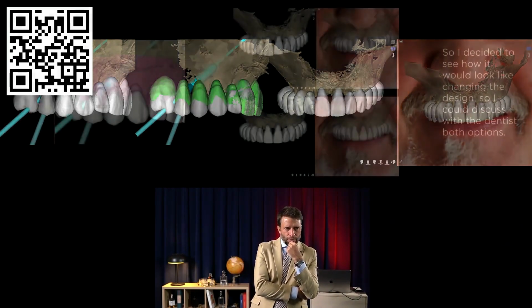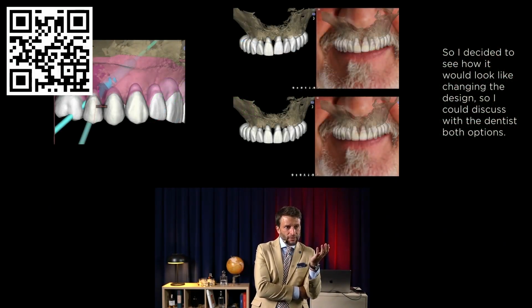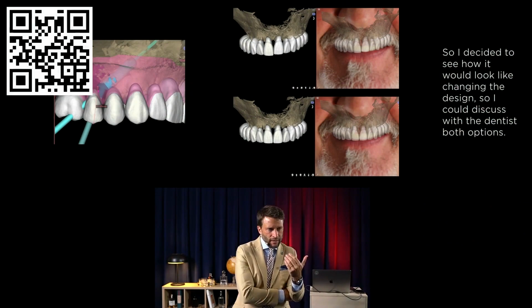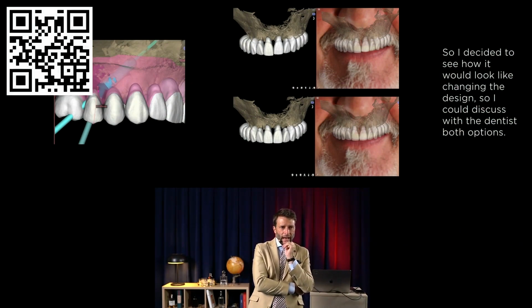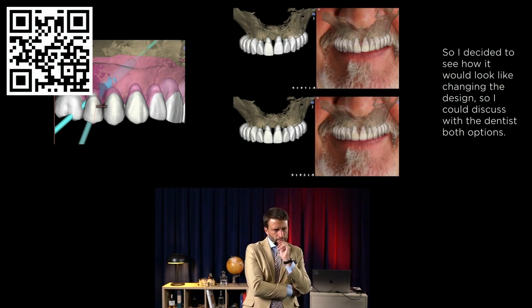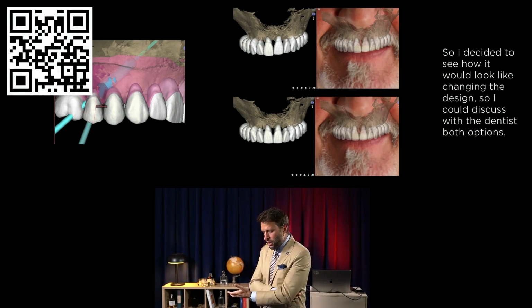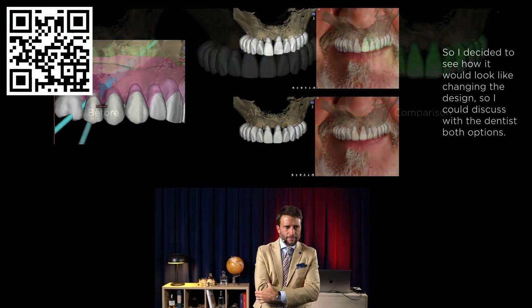So, of course, as you bring the design down, now there's more space for the implant. It's much better, a simpler surgery. We don't need to do the grafting anymore. We can fit the implant and the emergence profile. So the question is, does this longer design fit the face?